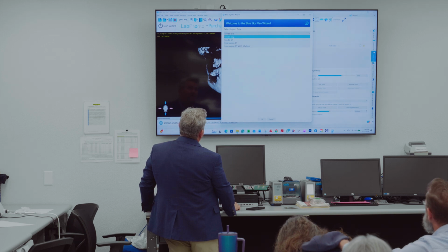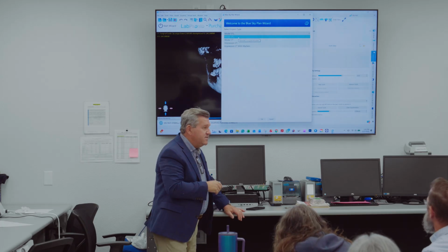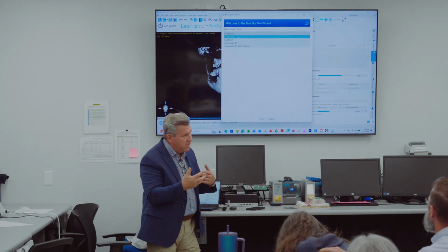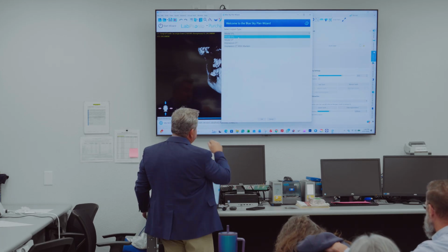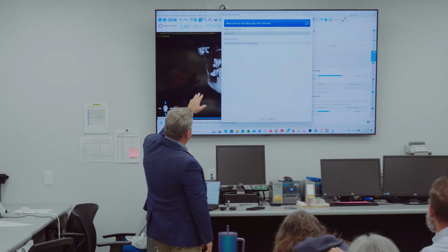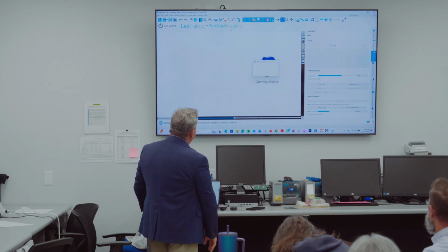Also, this is a model STL case. We're going to upload an STL in a second. If you were to choose model CT, for example, a lot of CTs now you can actually scan models and get a file, and that's a model CT. We're actually looking at DICOM files that need to be converted. That'll convert your DICOM file if you were to choose model CT, or the same thing with impressions. But we're doing a model STL, and we're using the Blue Sky Bio fully guided surgical kit. All right? All right, click OK.